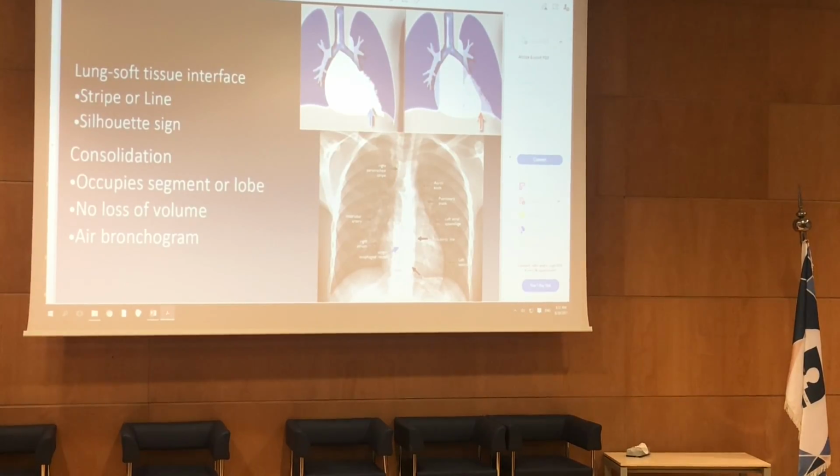So when you're checking the X-ray, you need to check these lines and stripes to make sure that they are normal, right? And inshallah, when you graduate, your lives are going to be much easier than when we started, because we used to have film radiography, right? And we used to put it on a light box. And everyone had a magnifying glass. You cannot be a radiologist if you don't have one. So you have to manually magnify each part and bring it closer to the source of light. But now with the digital radiograph, you can window, you can pop up the image where you want, okay? So all these areas, you need to pop it well and see it well. And that's why you have to have this systematic approach so you don't miss anything.